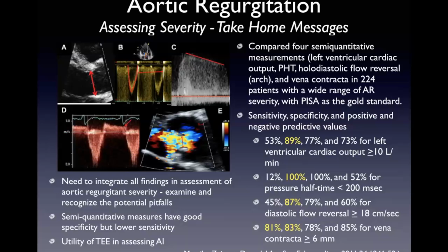Now the guidelines will talk about if they're too old, they're going to have to be redone. It's just we're trying to acquire all the data. So we always need to do it exactly the same as what you would with MR. We need to do quantitative assessment. And the other thing I think with the PISA, once you see a PISA, you know there's significant disease. And that, of course, is the highest likelihood.